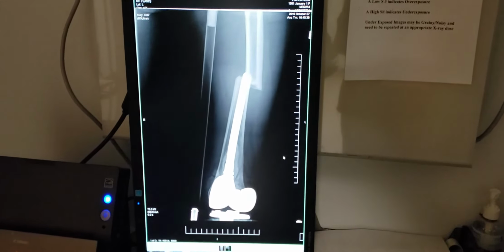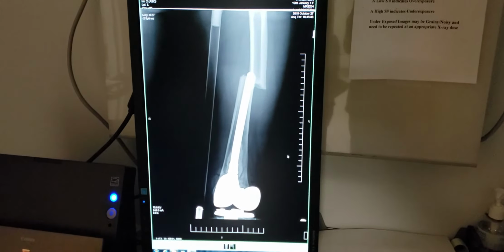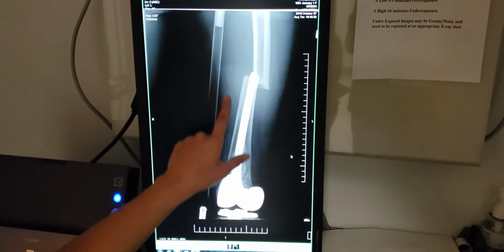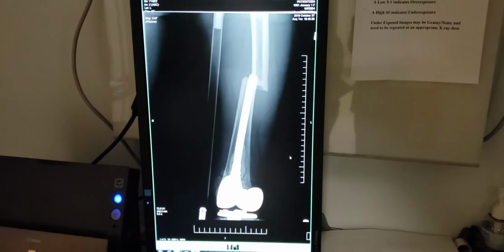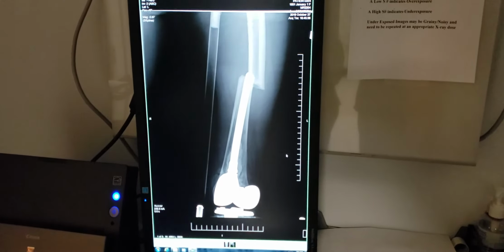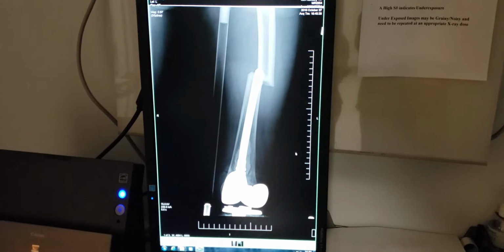The part I would say is properly demonstrated. You can see the distal femur and knee joint, and here the fracture is better visualized than the proximal portion of it. We did find out for this patient, they also ordered knee views, so a few knee x-rays.